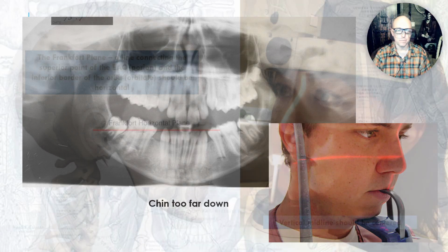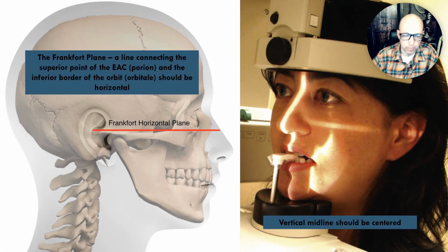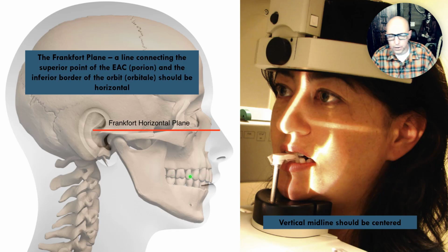This is too far. Oh, I do talk about it. Here's the Frankfurt plane. Superior point of the external auditory canal, or the porion, to the orbitale. What happens to the occlusal plane when you do that? Just a very slight downward angle. That's what I'd like to see in every radiograph.